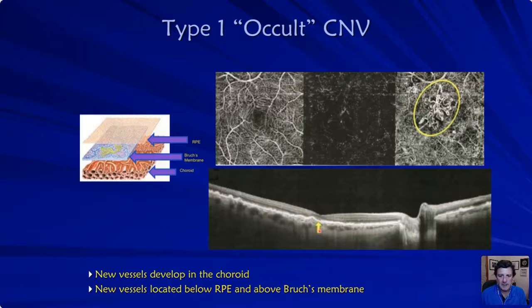How many of you out there, raise your hand, I know I can't see it, would say, hey, there's a choroidal neovascular membrane there? And there is, and you can see it beautifully right here in this choroidal picture. It's not in the outer retina. Sorry, I coughed in your ear, and that was loud. I apologize. But this photoreceptor area has no blood. This is in the choroid. This is occult. It's below the RPE. This is the deep plexus.